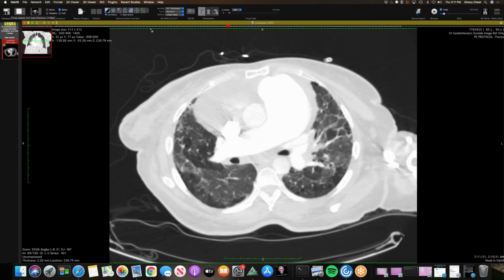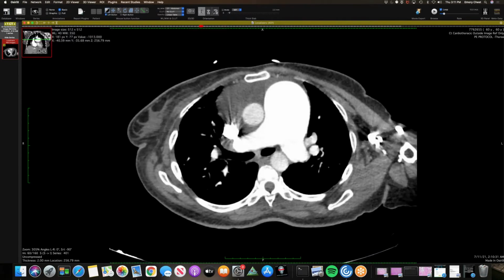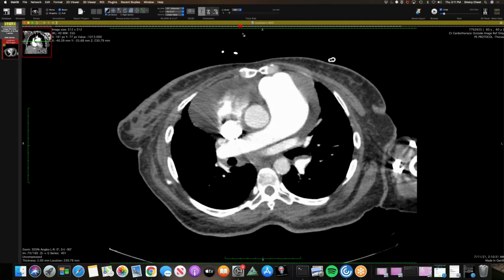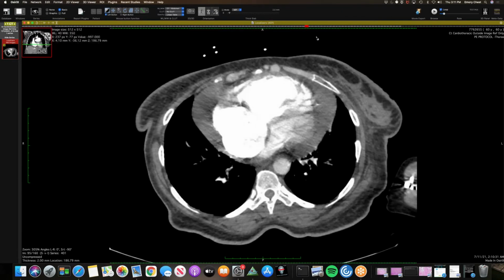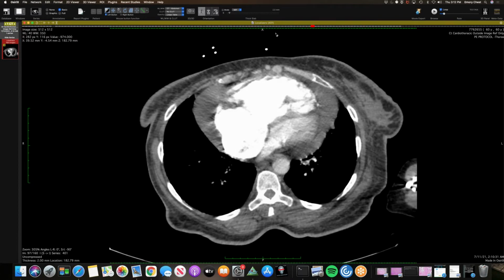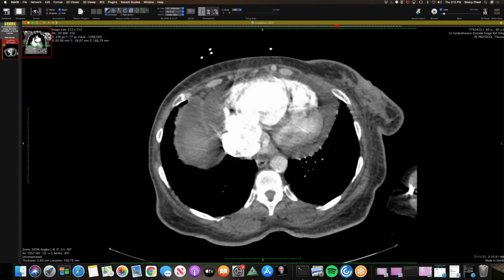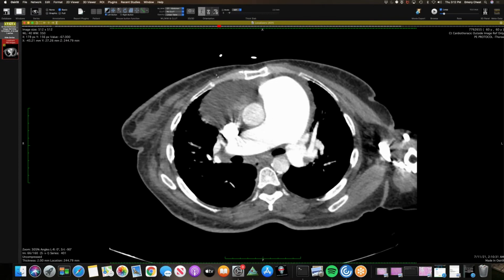So that degree of pulmonary hypertension is pretty unusual for lupus as well, right? Yeah, I don't remember specifically. What I usually see more commonly are small pleural effusions and pericardial effusions, so serosal disease. This person obviously has severe pericardial disease related to lupus, and this is obviously very bad pulmonary hypertension. Yeah, the lupus ones with this often have CTEPH, because we know that's a thrombotic state.